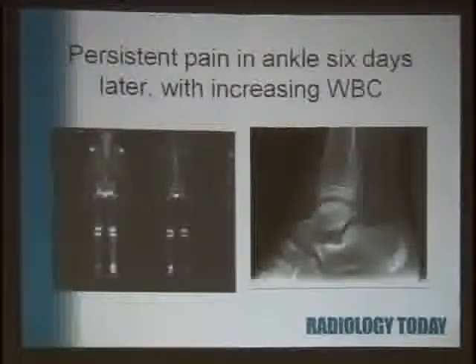His ankle was swollen, it was red, he screamed if you touched it. He was having a bone scan because his doctor was trying to figure out what was going on, and sure enough, it really lights up in his distal tibia, and there's some hyperemia, secondary hyperemia, and it's up his tibia and down in his foot.